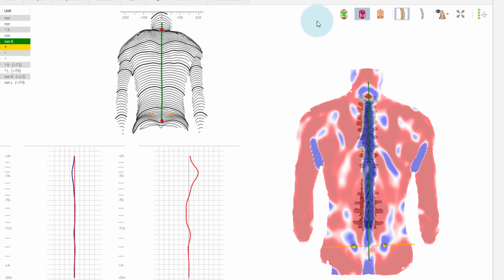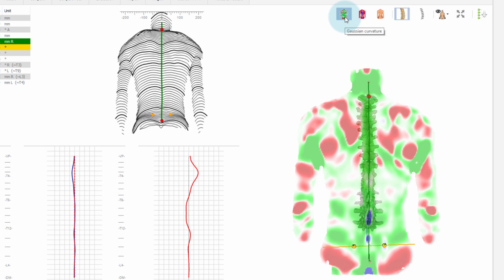Thus, the local expression of the concavity of the lumbar dimples and the convexity of the spinous process of C7 can be recognized very well on this model. But soft tissue-related imbalances also stand out well here. Like the mean curvature, the Gaussian curvature represents concave in blue and convex in red. The approach considers not only the surface course from left to right, but also the course from cranial to caudal. Only the areas that are clearly defined in both directions of observation are colored red or blue, and indifferent areas are colored green. The principle can be illustrated somewhat using the example of thoracic kyphosis.